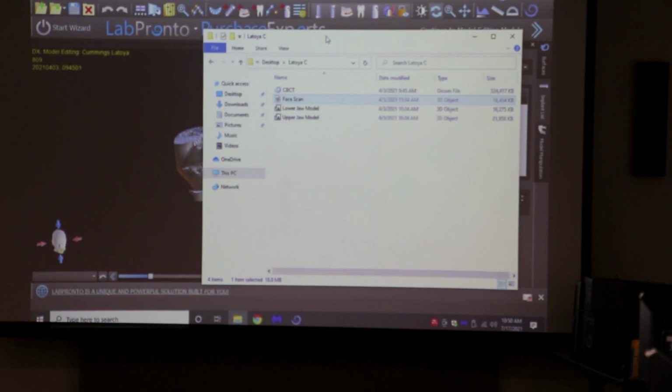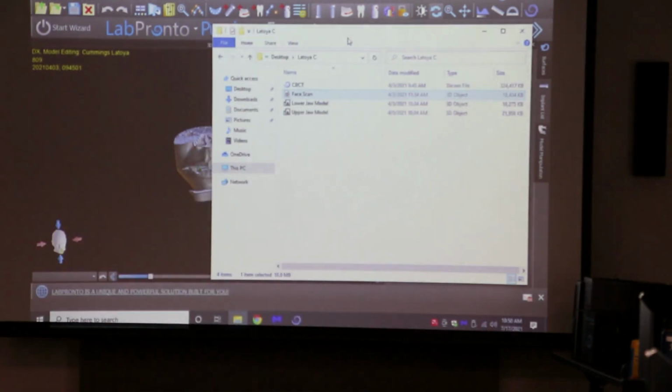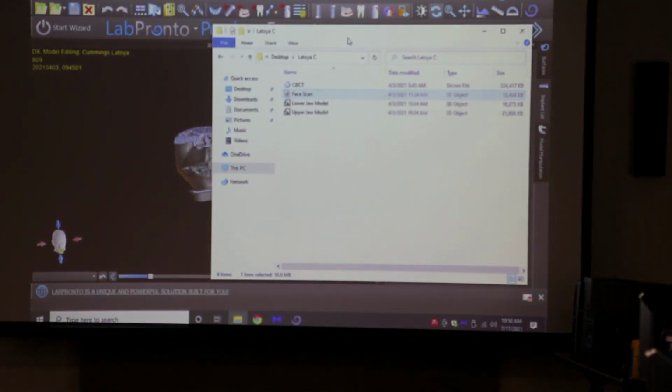For the course, did you just put everything in the computers? Okay. So when we dropped all the files in, when you download it, it comes with a color file associated with it. Basically, it's the skin for the object.